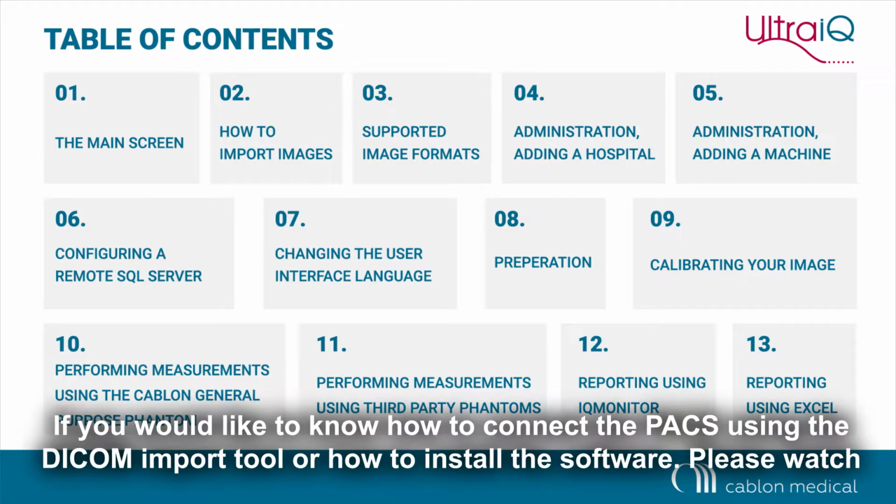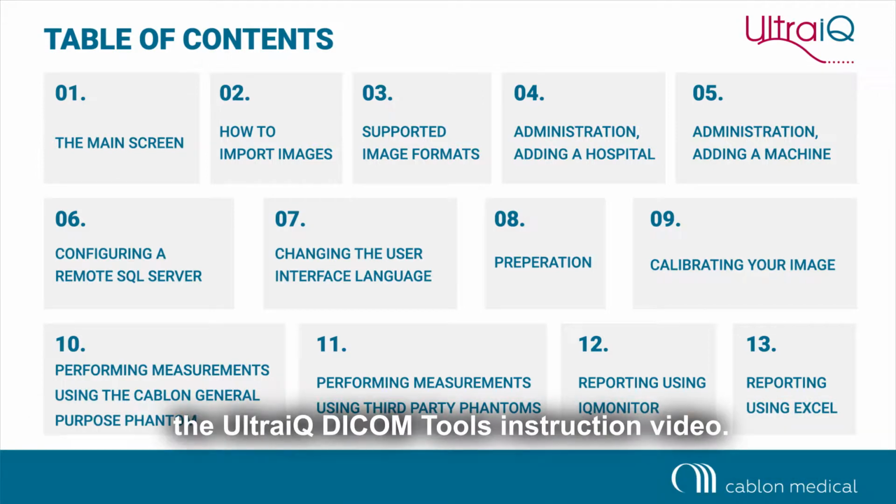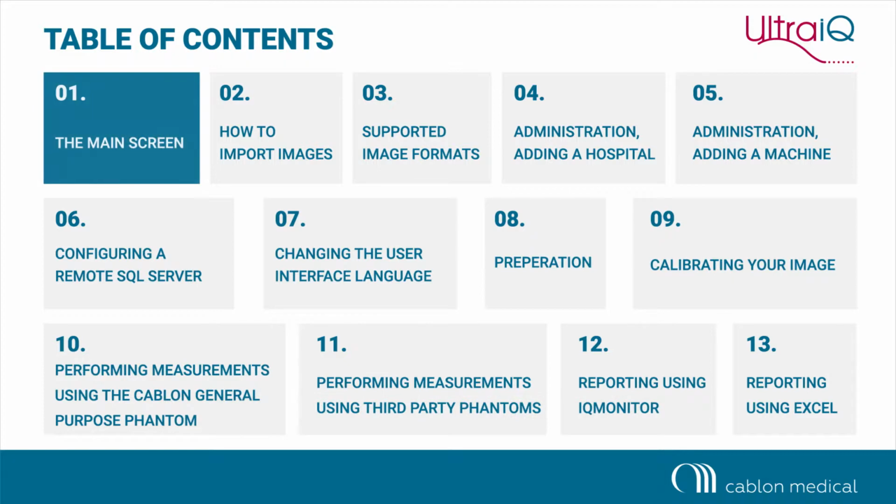If you would like to know how to connect the PACS using the DICOM import tool or how to install the software, please watch the UltraiQ DICOM tools instruction video.